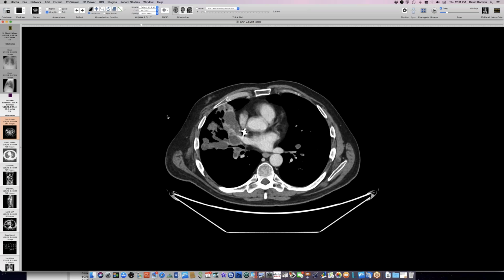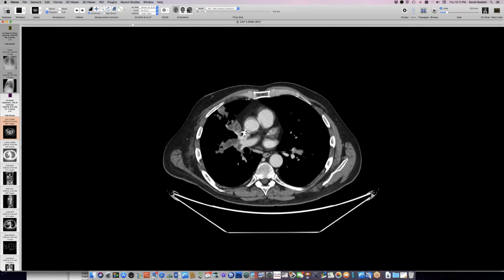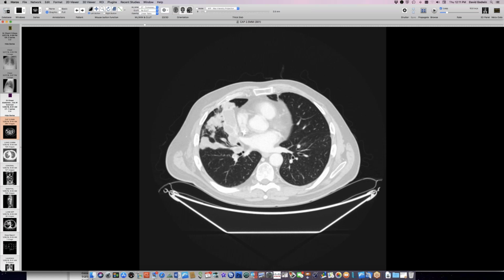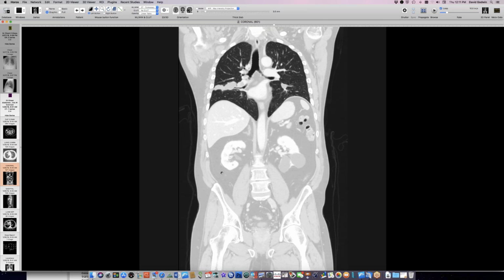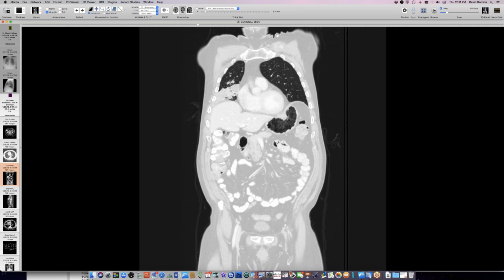These are the fattest, most pronounced end arterial metastases that I have seen. We've got them on both sides, more on the right than the left, but clearly within vessels and branching out all over the place. And this comes out nicely, I think, with the coronal views here. You can see this vascular pattern of filling with this metastasis.